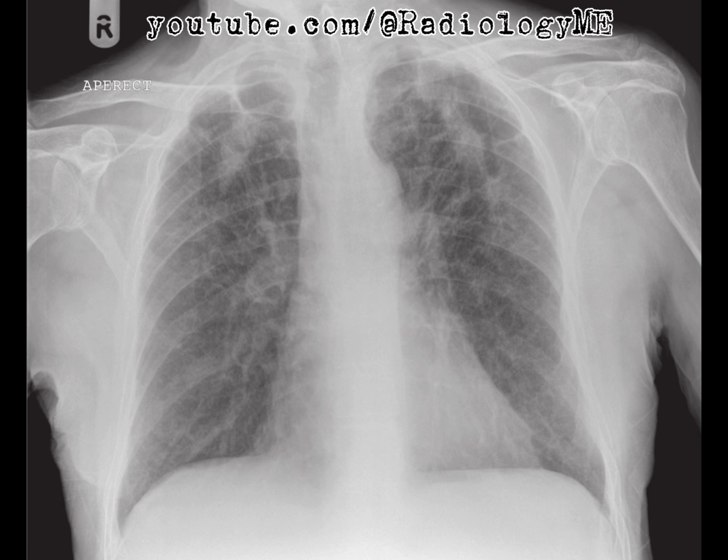So what else could it be? Let's say there's no history of occupational exposure. In that case, we might consider an alternative diagnosis, something like sarcoidosis or perhaps ankylosing spondylitis, though the latter is less common. The symmetry here really pushes us toward dust-related causes, though, so it would be prudent to get a good occupational history. In fact, symmetrical upper zone fibrosis should make you think of a dust-related disease unless proven otherwise. Ankylosing spondylitis is one of the rare exceptions, but generally, dust exposure takes the lead in these cases.